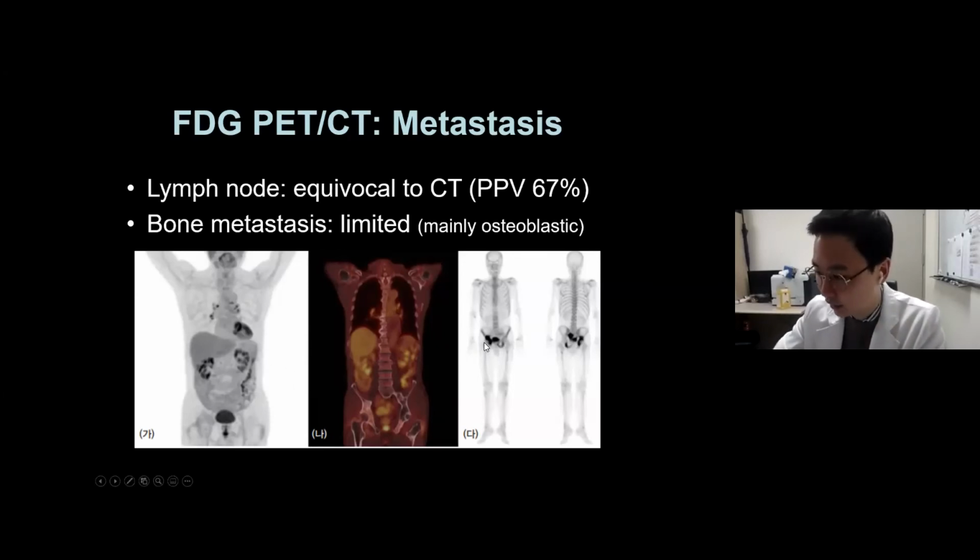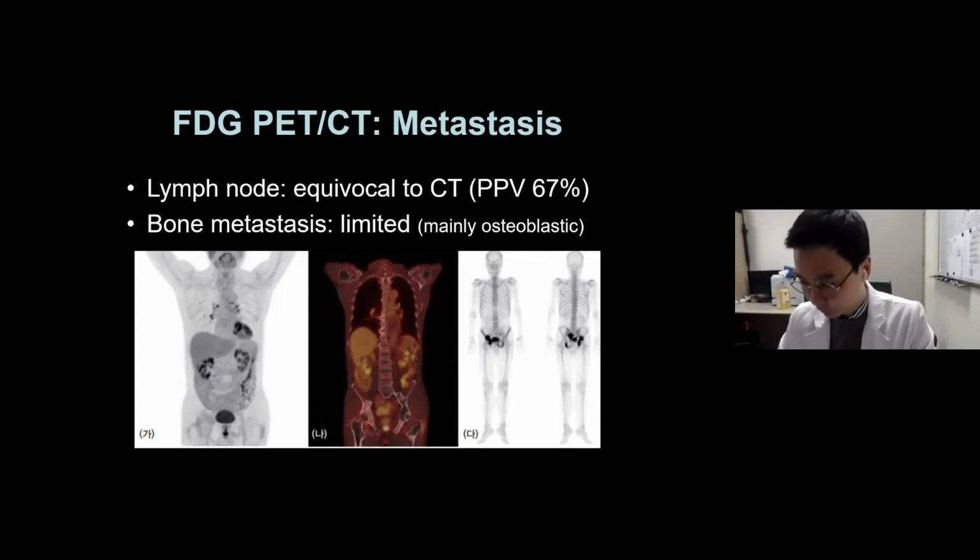Like here, the bone scan has very high uptake in the acetabulum bone metastasis. In the PET, the corresponding lesions in the CT are sclerotic, however, the FDG uptake was relatively mild. So evaluating bone metastasis can be limited using just the FDG uptake.